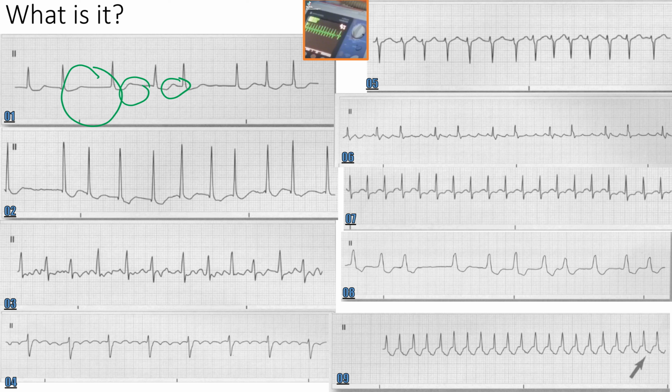All right, next one. We put AFib with RVR. I didn't ask if it was controlled, or slow ventricular response, or rapid. So the first one, actually going back, how many complexes do we have? 80. Got a rate of 80, so that is controlled. So probably add controlled there. All right, controlled.